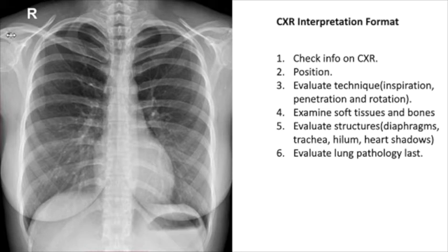When you go to the lung pathology, you have to look at the lung, so you have to apply the general principle. You have to serially compare in order, comparing both sides of the apex, the middle part of the lung, and the inferior part of the lung, comparing both sides at the same time.